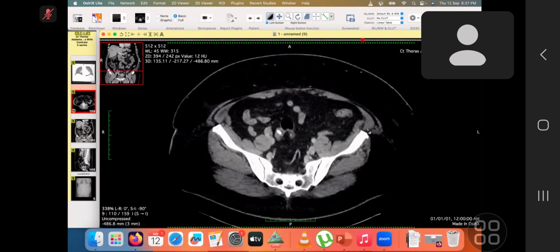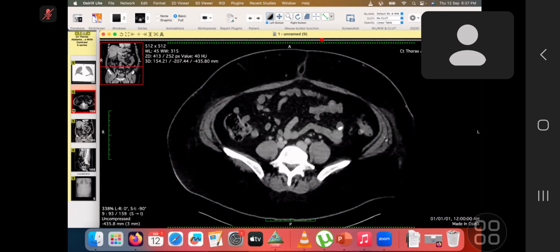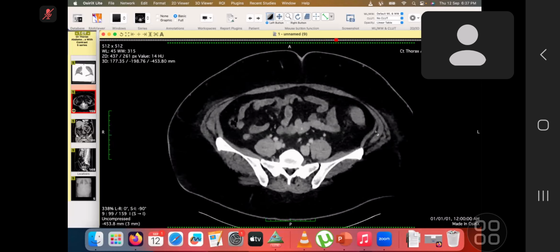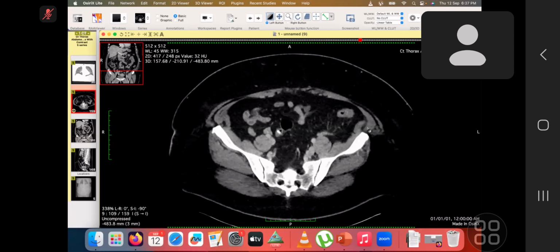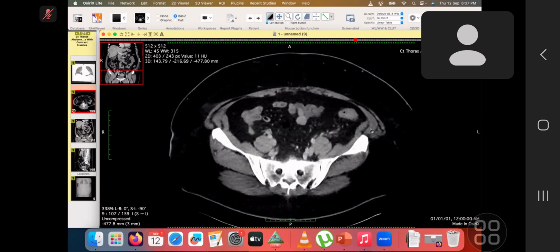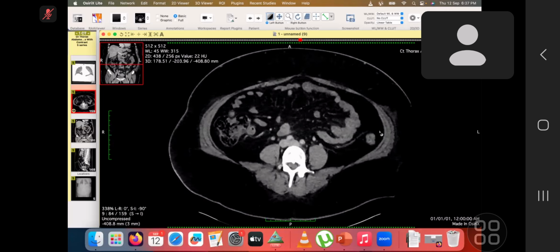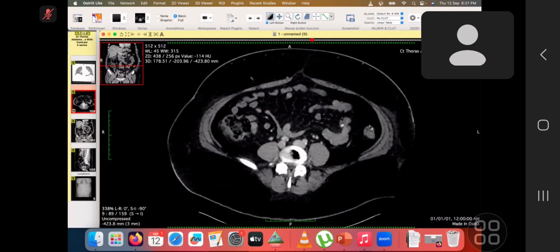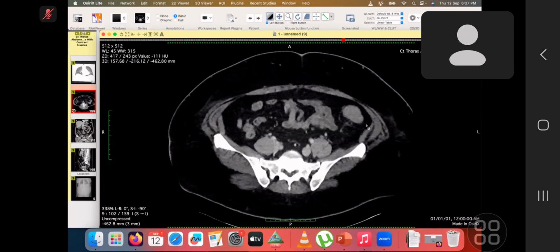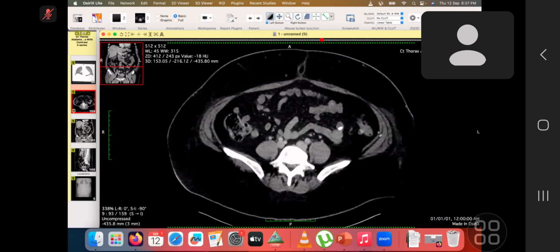So just reviewing the same region in the left iliac fossa, there are again several uncomplicated diverticula, and the stranding that I saw previously has improved. I'm just reviewing the bowel wall, checking to see whether there's any evidence of mural thickening. There is still some residual stranding surrounding the bowel wall, and the bowel wall does look thick-walled in this region. I can't see any surrounding lymph nodes within the region.